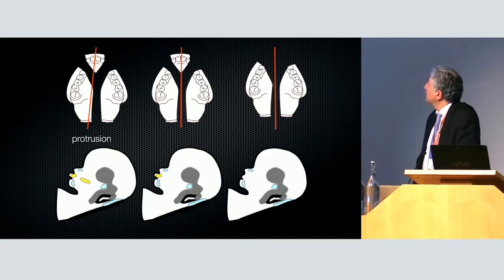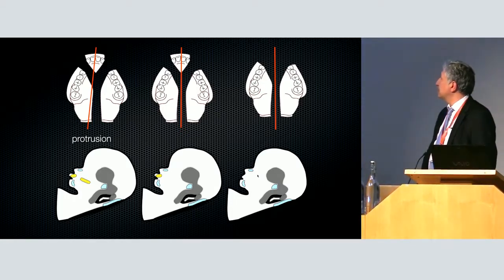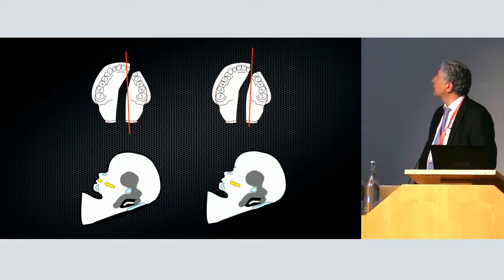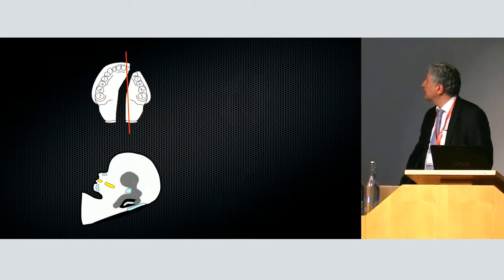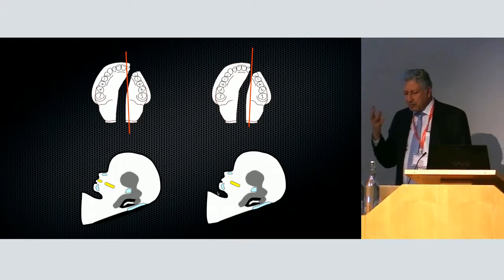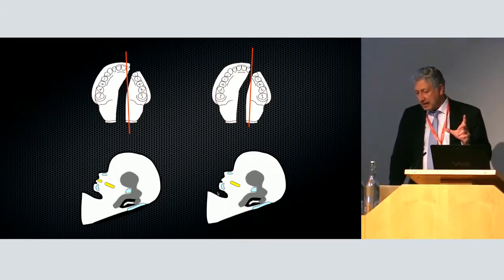If you have some median cleft, you don't have any maxilla seen in this plane. And so you can imagine how the other combinations can be. So this one or that one, even without the anterior part. So the possibilities of having abnormal images in this plane are likely, depending on the size of the cleft.